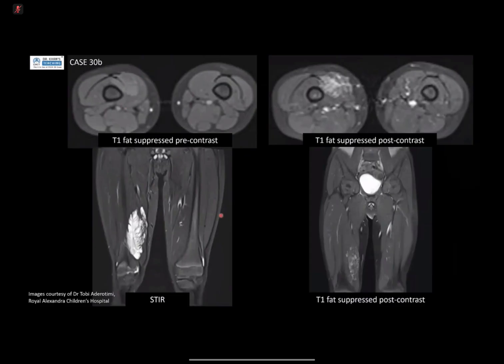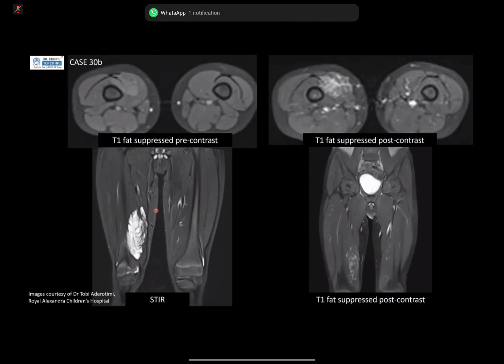Then going on to MR. Some clinicians, if they want to operate on it because it's very extensive, will ask you to do an MR. These are the post-contrast pictures, and the post-contrast and pre-contrast ones show just cystic spaces or cystic signal ill-defined lesions that look quite bubbly. In post-contrast, depending on how delayed you acquire these images, you can get enhancement within them. This is more on the difficult spectrum, but it's just to complete things: if you're talking about hemangiomas, then we need to talk about the vascular malformations as well, but it's unlikely to come up in exams.